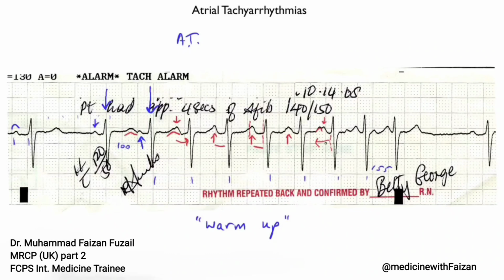Now look at the next one. You still see two bumps, but they're much further apart. Which one has moved? Which one looks like it's associated with the QRS? I think that's the P wave, because that's closer to the QRS. But it turns out that this is the P wave. Now, how can you say that? How do you know that? Well, it wasn't here. And it's unlikely that the T wave moved, because the QT interval cannot suddenly shorten. So because this is the signal that's moving, it's likely that this is the P wave.